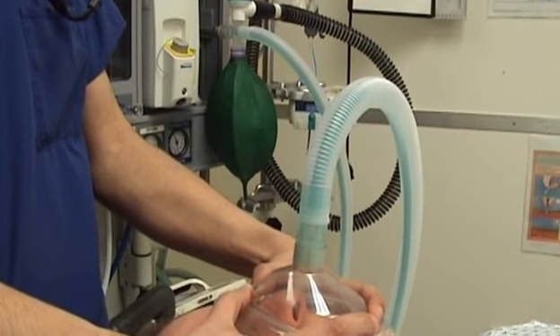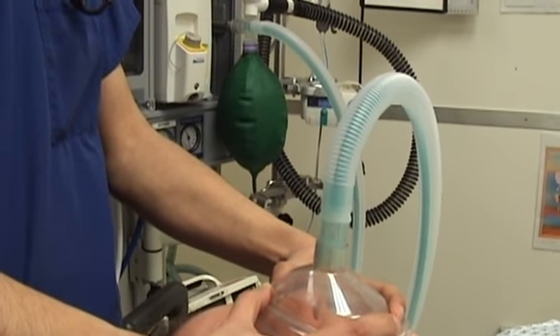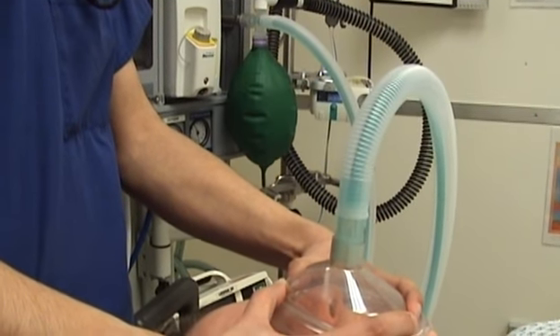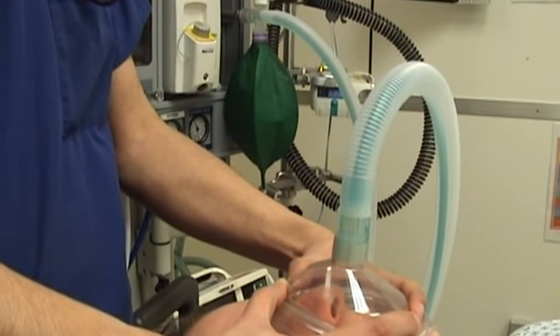To help with compliance, the nursing staff, and in the case of children their parents, must be closely involved in the prescribing of oxygen. Parents may have previously witnessed oxygen being given only to children who are unconscious or moribund and may need further reassurance. You may now understand why anaesthetists use more sophisticated equipment with valves, tubing and reservoir bags that ensure that a patient is breathing 100% oxygen before or during certain procedures.